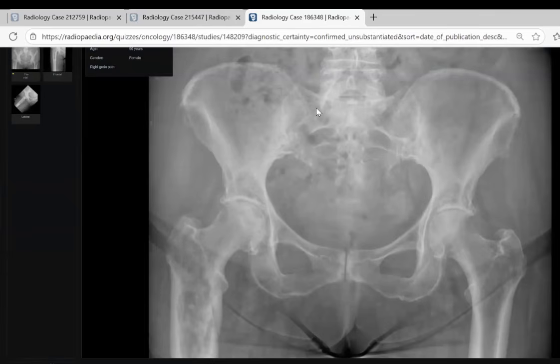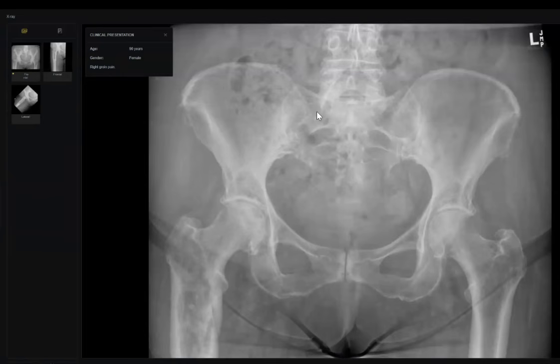Sorry, my colleague, in the last case we were doing MRS, not MRCP. MRS means MR spectroscopy. Choline is high because it is related to the high turnover of the cell. And N-acetyl aspartate is the normal neuronal marker of the brain, so it is disturbed in glioblastoma multiforme.